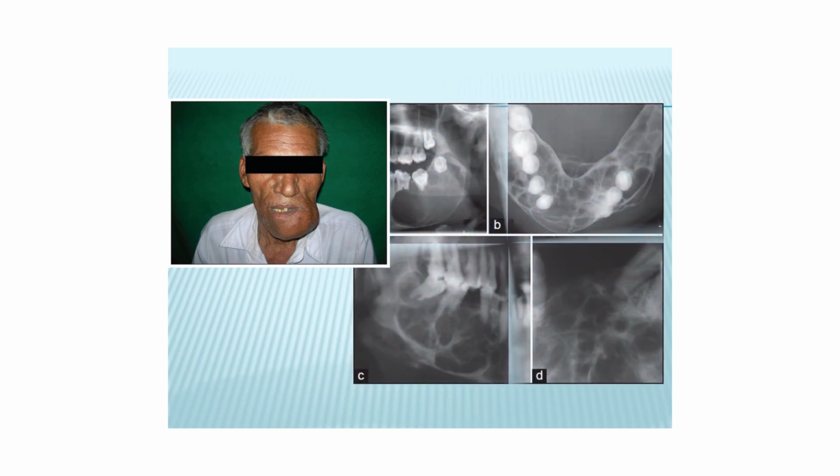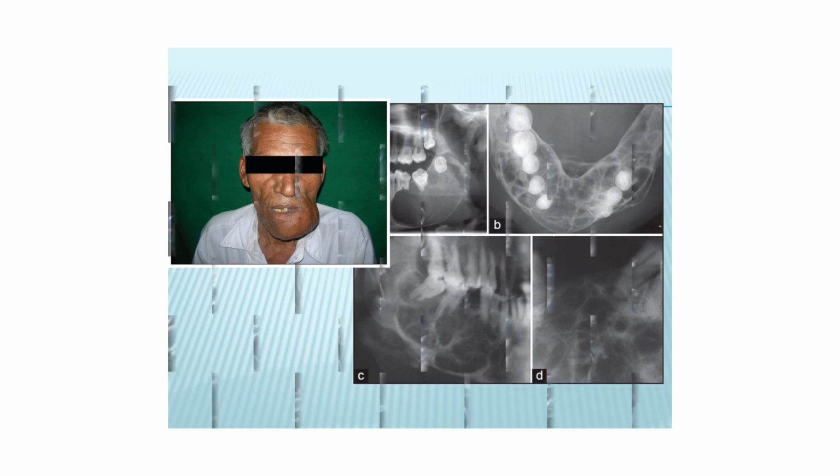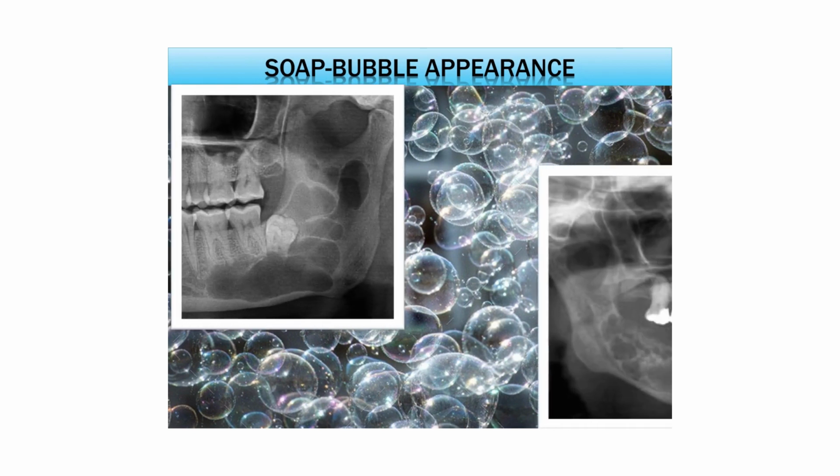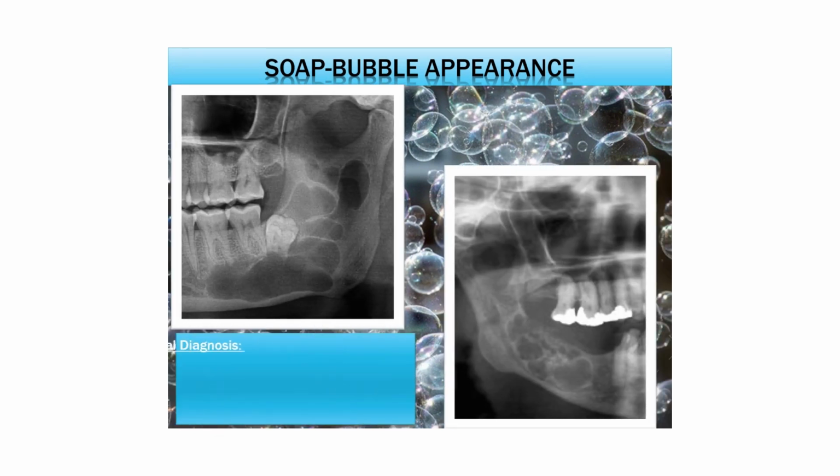Multilocular radiolucent lesions have varied appearance depending on their internal arrangements. Lesions presenting with circular compartments of varying sizes that appear to overlap give the appearance of soap bubbles. This is seen in ameloblastoma, aneurysmal bone cyst, keratocystic odontogenic tumor, and central hemangioma.